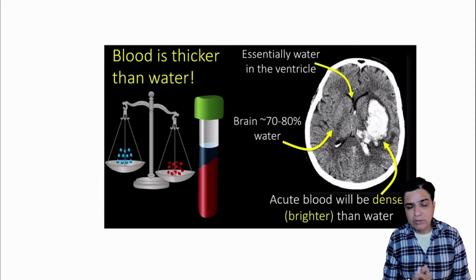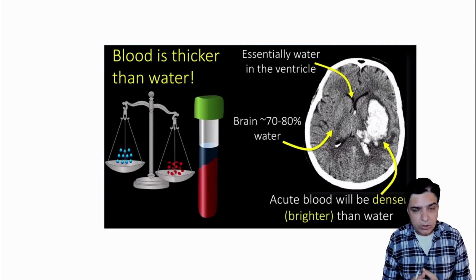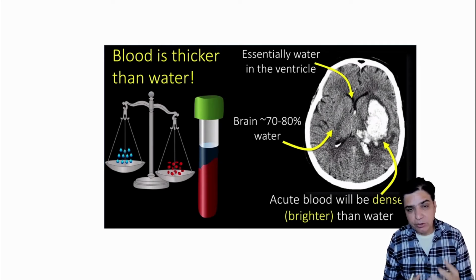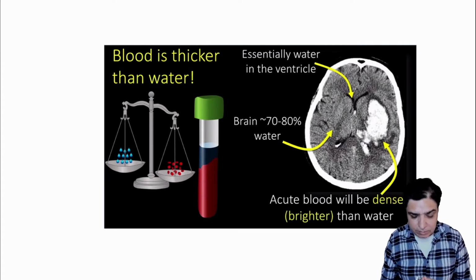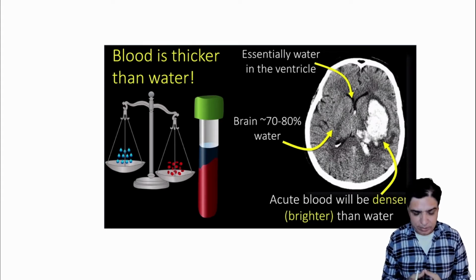Now, if you're thinking about intracranial tumors, CT scan can pick them up. Most CTs would pick them up, but still, it's not considered to be the diagnostic modality of choice for picking up tumors. Usually, MRI is far superior to CT when it comes to brain tumors. Anyhow, focusing back on the CT brain, the focus of this lecture is mainly how to rule out different types of bleeds inside the brain.